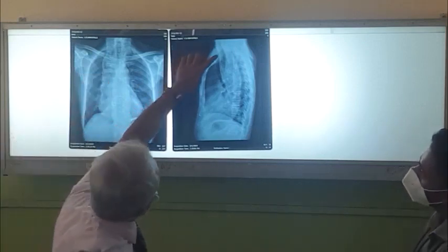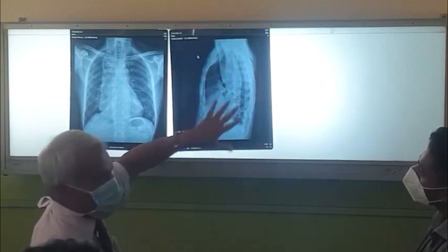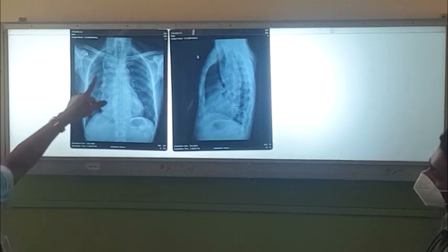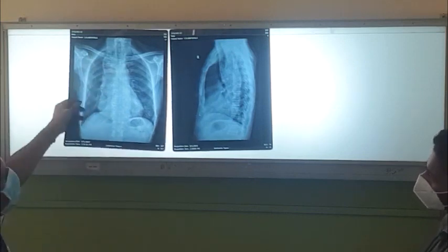So this is the trachea, and it is behind the trachea. What is the structure behind the trachea causing this disease? So this is achalasia cardia with some food materials, dilated esophagus.